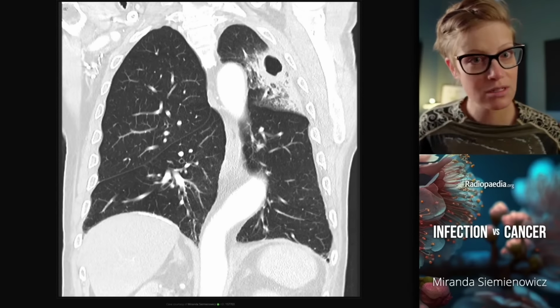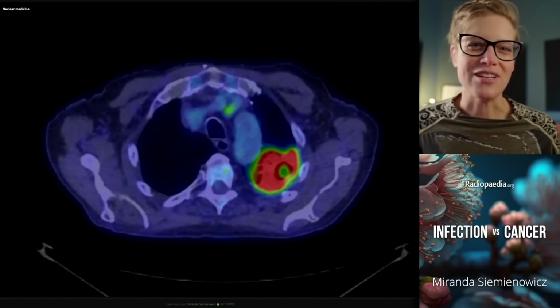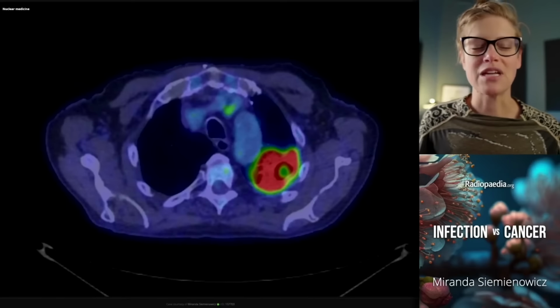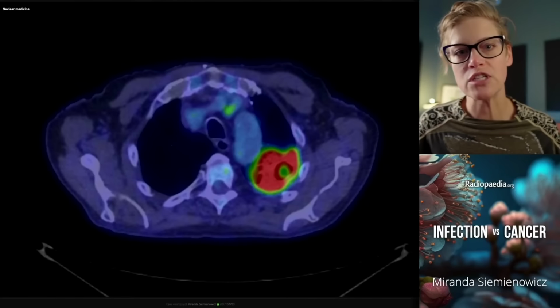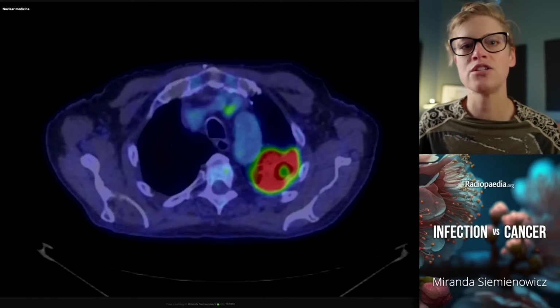Somebody got upset. They did a PET. And it really doesn't help, because now this is a donut lesion. And now, again, we're obliged to think about it being a cancer, but we can see from that diagnostic CT those clear morphological features of infection, of a benign process. The lung is in charge.